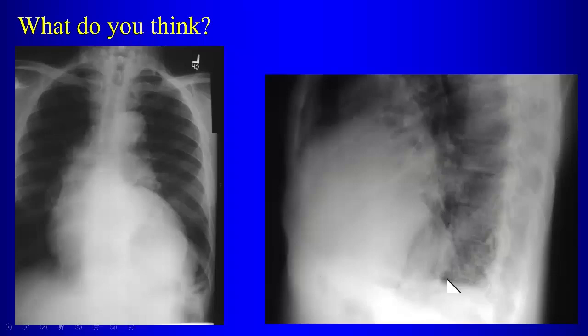Okay. So now what are you concerned about here in a patient who has a history of recent myocardial infarction, who has bulging extending from the posterior region? Also, the patient has a pleural effusion, but now we have bulging from the posterior aspect of the left ventricle in a patient with a recent history of myocardial infarct.